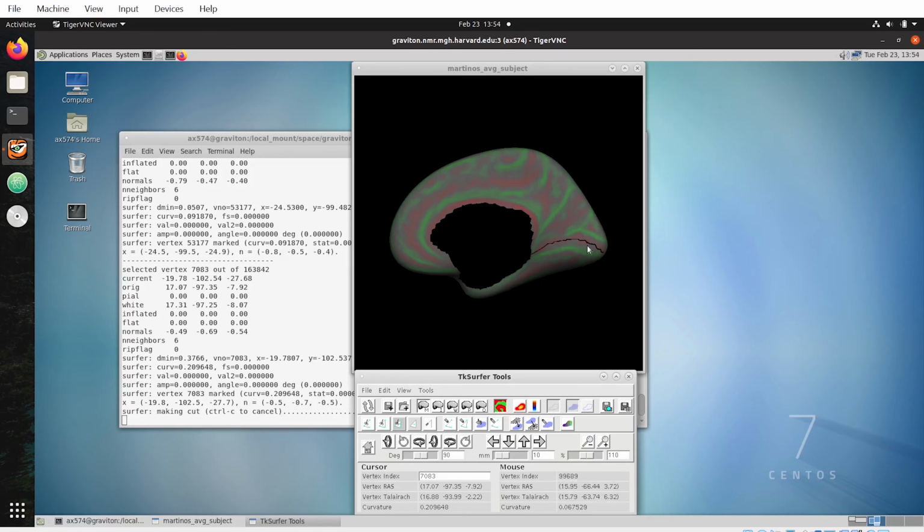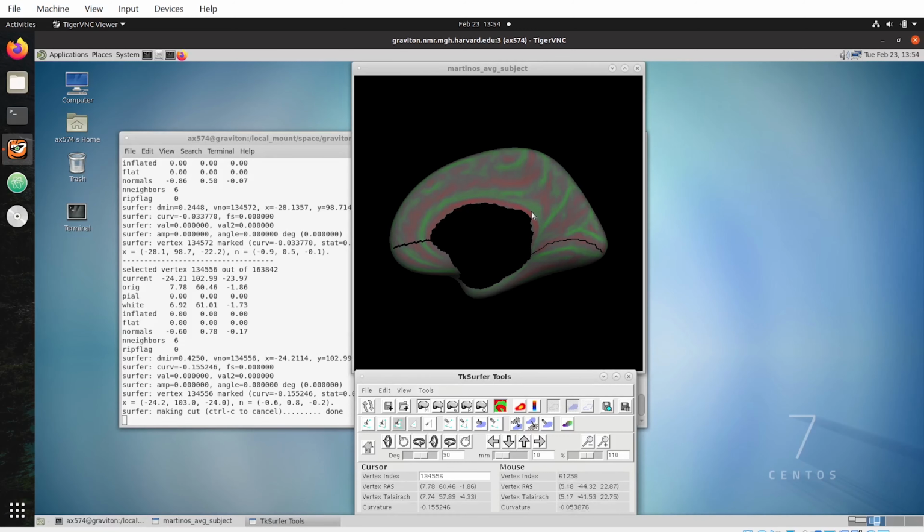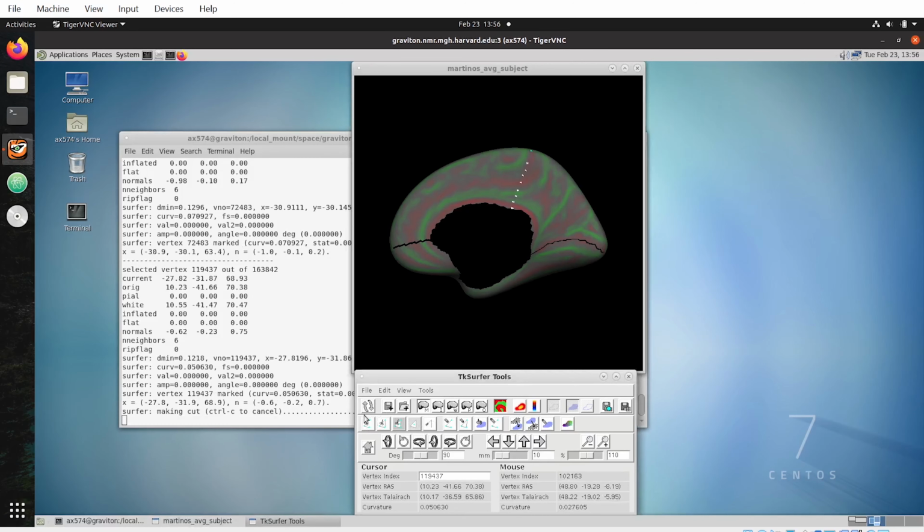Wow, that one almost never works on the first try. Awesome. Beautiful.